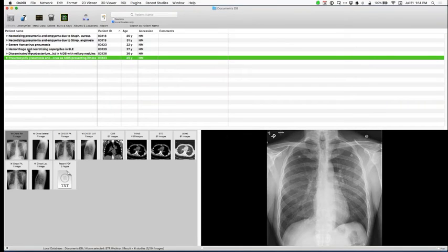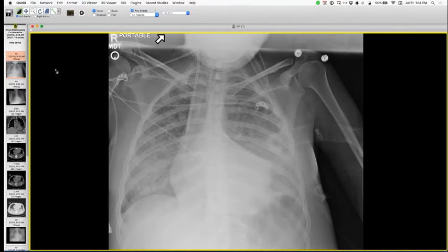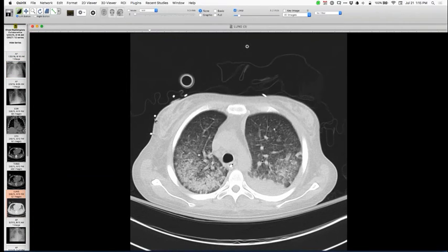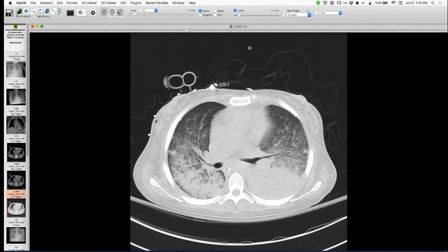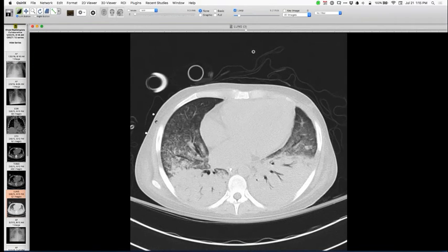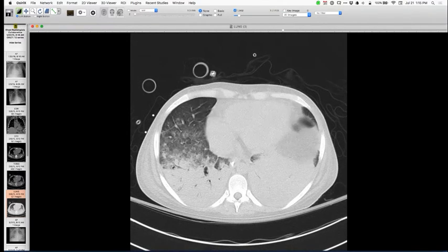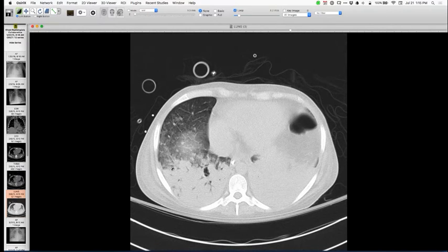The last one I'll show you is kind of interesting. So the context here is this unfortunate patient with SLE and pulmonary hemorrhage. Here you can see she's very ill. She's intubated. She's got diffuse lung opacities consistent with diffuse severe pulmonary hemorrhage. And I will show you a CT done about a week later, in which we see all those opacities, certainly consistent with hemorrhage, and a finding that could easily be overlooked amidst all that in one location is this right there. So here's an area of cavitation in that right lower lobe.